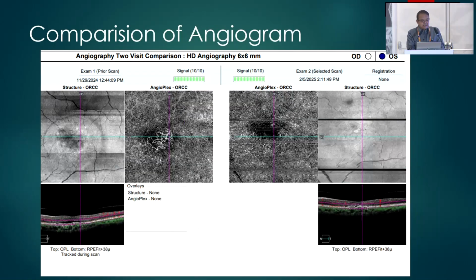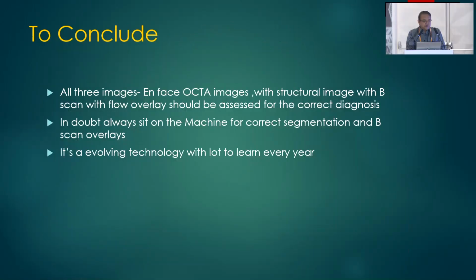This is a very interesting patient. You can see a CNV here. This patient was on anti-VEGF therapy for 2 years, on 6-weekly therapy. And after 2 years, you can see here the MNV or the CNV has disappeared. So you get a wealth of information on OCTA.